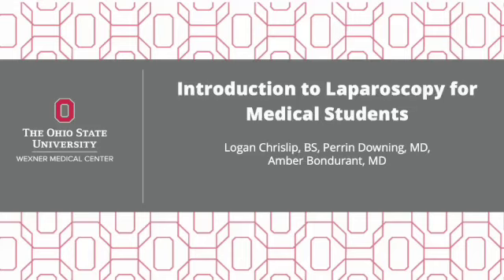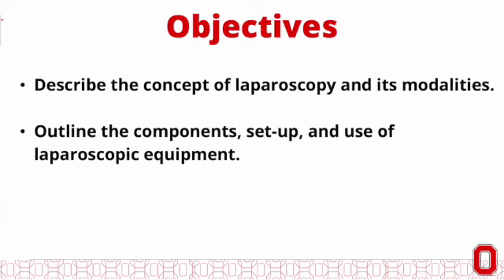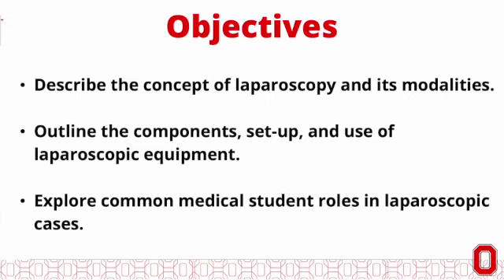This video will focus on laparoscopy, a common gynecologic surgery modality. Here, we aim to describe the concept of laparoscopy and compare its major modalities. We will outline the components, setup, and use of laparoscopic instruments. Finally, we will conclude by discussing common medical student roles in laparoscopic cases such as operating the laparoscope and closing the port sites.